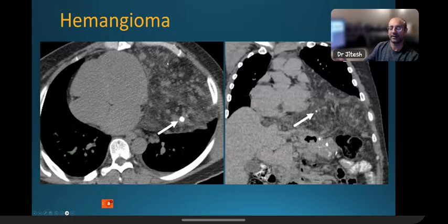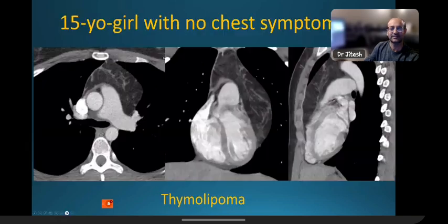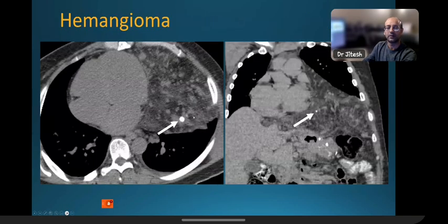So this is again not an easy diagnosis to make when we have this kind of lesions with vascular structures. They could be highly vascular or low vascular, like a venous structure, capillary structure, which are slowly filling or less enhancing. And then we see phleboliths, prevascular mediastinum. So this is a case of hemangioma.